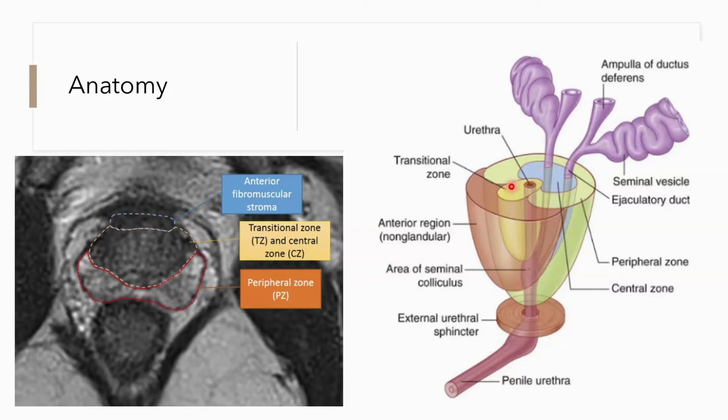So you can appreciate the 3D anatomy of this area, and this area usually has a heterogeneous appearance in relatively older people, because benign prostatic hyperplasia generally affects these areas. Behind these two zones, circling it like a C or a kidney-shaped manner, is the peripheral zone.